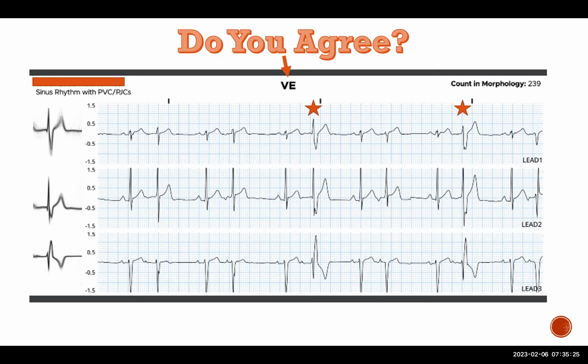Do you see anything before each of these complexes? Look in the lead, what they call lead 3. Oh, down below. So there's a tiny blip after the T wave, and if we think it's a P, then there's a long PR. Then we have either a pause or a blocked PAC, again buried in that T wave. So I think in the beginning it's probably atrial bigeminy, and I think it's atrial bigeminy throughout. Right, and then it's just curious why this QRS complex looks different from the other ones.